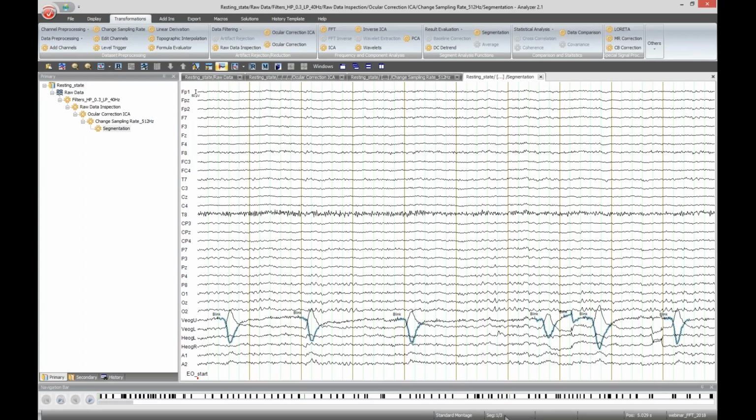So you see here at the status bar, these are the 3 blocks for the eyes open condition. As I have said in the beginning, 3 blocks for eyes open, 3 blocks for eyes closed. And that is what we get here by extracting segments of eyes open. To keep track of what we have done, I will include this information so that we will know that we have already finished extracting portions for eyes open.